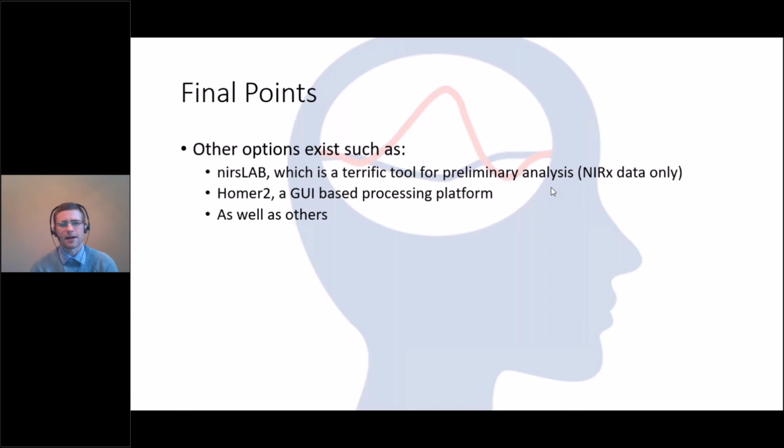So the AR_IRLS is a way to solve for your model, and it's fairly complex. You can think of it as a fancy ordinary least squares, if I'm not mistaken. The AR pre-whiten does not solve for the model. It's more of a filter. So one is kind of housed in the other, and outside of that, they're different functions. They serve different functions.